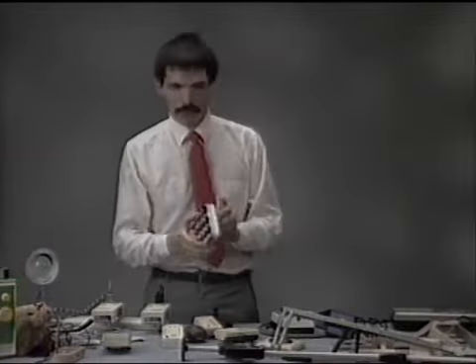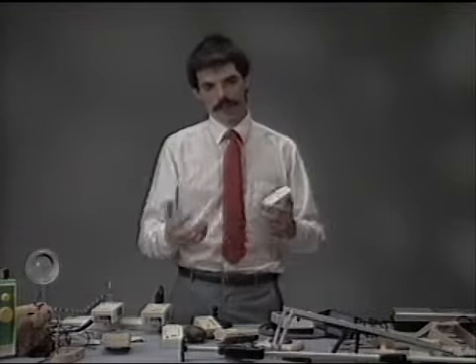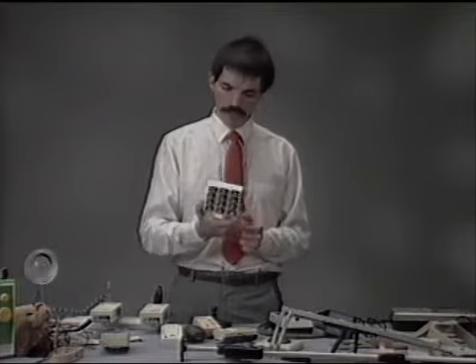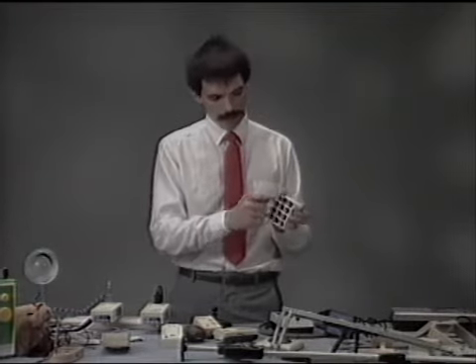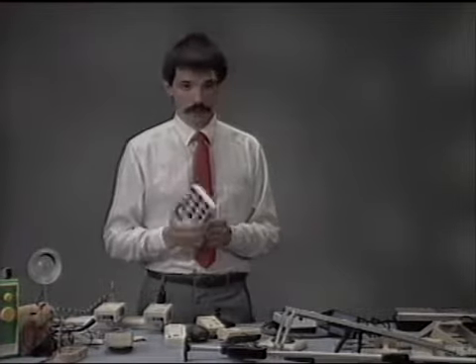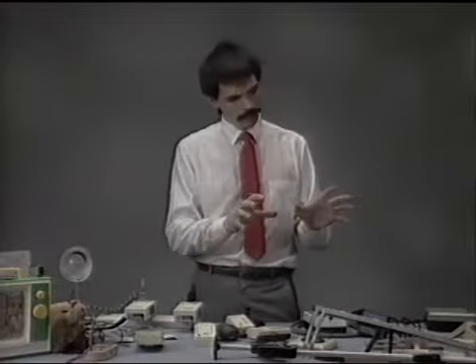Finally, another device that's particularly good on job sites and also at home. People ask me a lot, what kind of telephone should I buy? Should I buy one with big buttons? I have a small button telephone right now, but it's tough to operate those buttons. Devices such as this allow you to just Velcro right onto your existing telephone and allows you to hit all those same numbers, and they sell for less than $5. It's a great device.